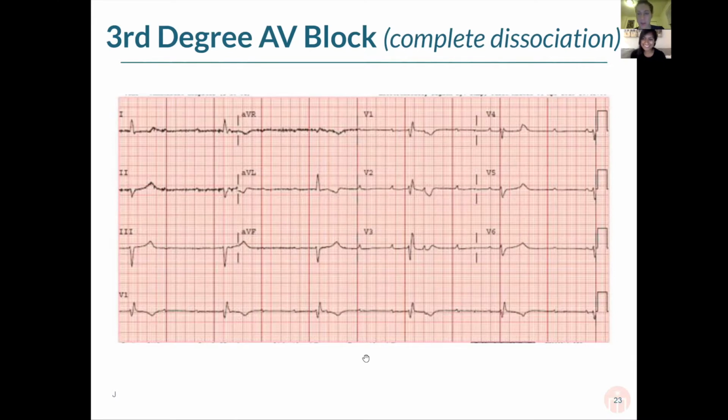I see people say, yep. So this is the patient where you're going to have atropine at the bedside. You're going to take pacer pads and put them on and probably try to start transcutaneously pacing them. Depending on where your facility is, some patients that might be hard to do, and you would actually have to, you know, try to get a transvenous pacer in if they couldn't get a permanent pacer. Other places you can go right to a permanent pacemaker if you have cardiology there that may take them.